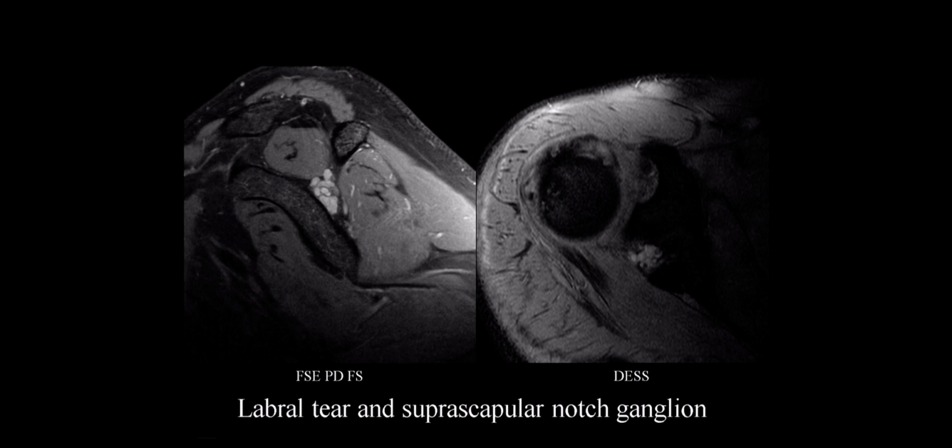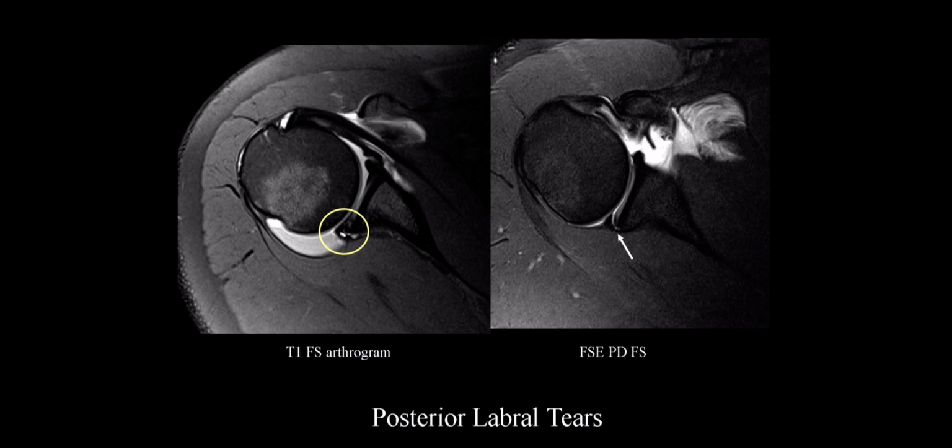Here's another case. But in this example, the location's more important. If you look, this is centrally located right within the suprascapular notch of the glenoid. This is where the suprascapular nerve runs. So this is very worrisome, and you of course want to look at the adjacent supraspinatus and infraspinatus, because if it's in this more superior position, it can actually affect the nerve supply to both the supraspinatus and the infraspinatus.